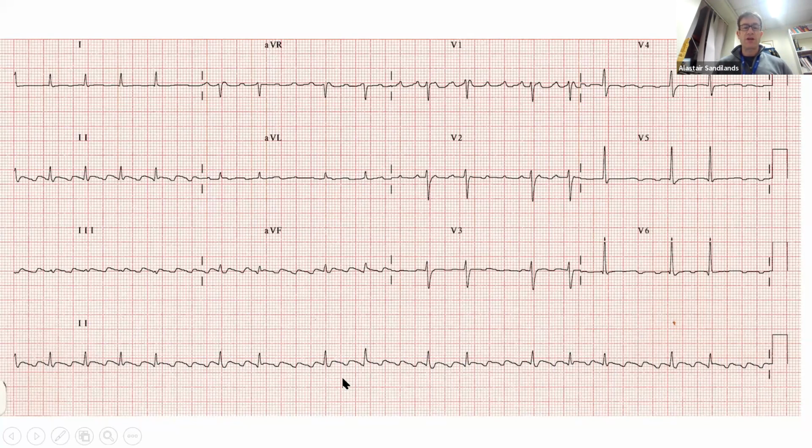However, it's trying to prove a point for you that sometimes the rhythm can be conducting to the ventricles at different rates. So you might say this is regularly irregular, or the conduction to the ventricles varies. You can see here that you've got the sawtooth pattern again inferiorly. So it's not discrete P waves. You've got a very small QRS here in lead 3. There's the QRS there. It's quite hard to see, but otherwise in lead 2, you see a positive deflection, and you've got the continuous flutter wave here.